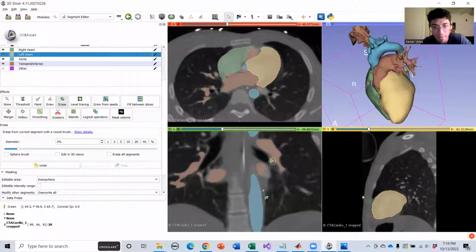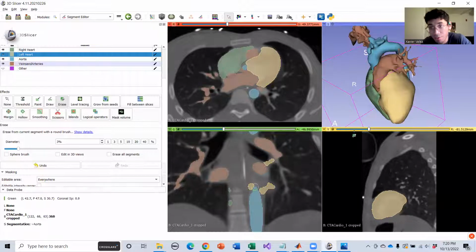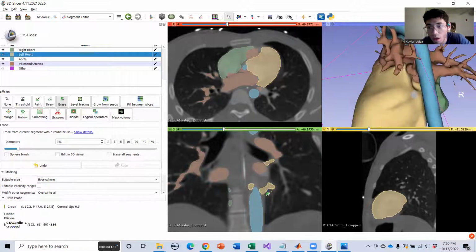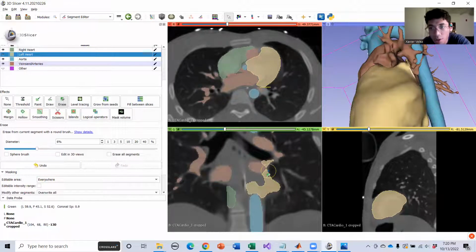We're going to erase that and remove it from existence entirely, right? Ooh, I left the part there. Maybe this is part of the heart forming. That's another thing where checking your 3D model, checking where these slices are is pretty helpful. I can see, okay, that looks like it's actually maybe part of the heart forming, right? Let's get a sideways look at it. Yeah, I could see that being the left heart, right? So it's starting to shape up.